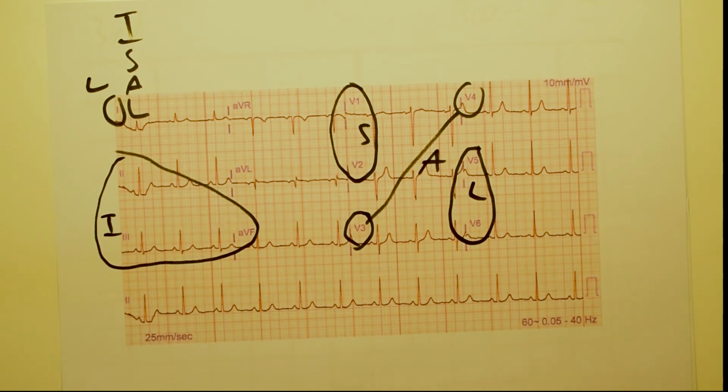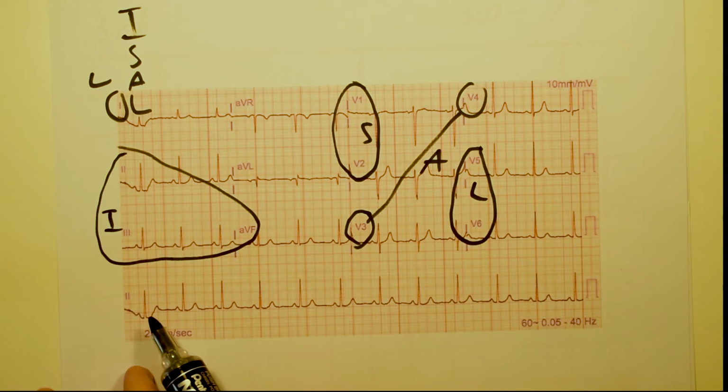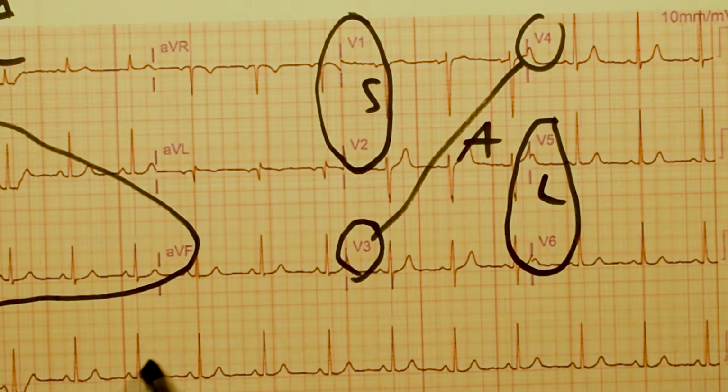In previous sections, we have looked at how you see ST elevation, and it's exactly the same on this. So we have looked at a bunch of ECGs, and we've always been looking at lead 2. So this is your classical lead 2. At the bottom, you can see that they have a long line of lead 2, so you can assess it just as we have assessed the previous ones. So you can work out your rate. See, there's 1, 2, 3, 4 big blocks in between, so 300 divided by 4 is 75.